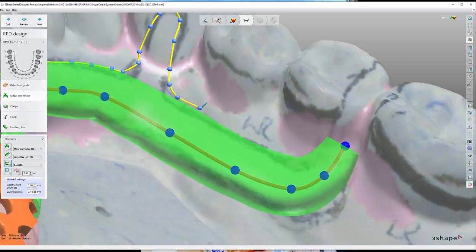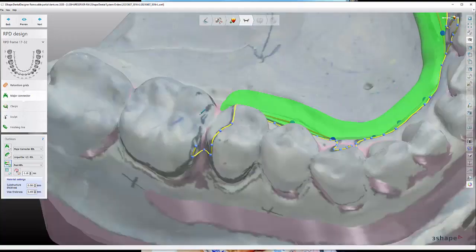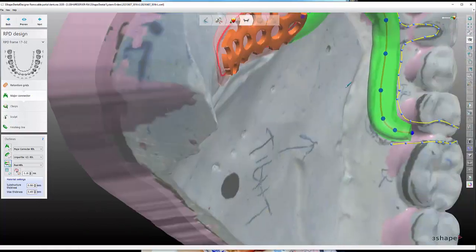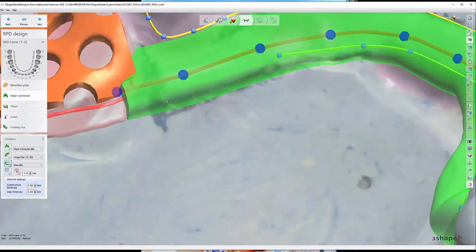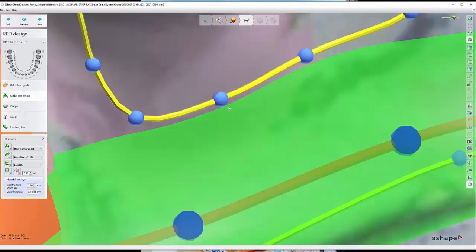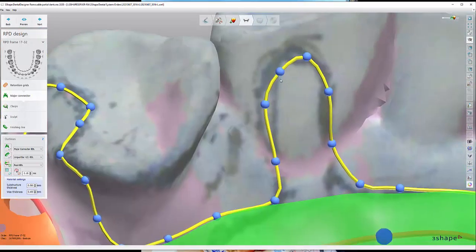I know people do this sometimes differently, where they'll just break out the individual rests. But this is what we've found gives us the nicest transitions for the frames. So I'm just sharing that with you. And I keep this within the green when I come back. So the most important part here really is just the leading edge on the top edge of the bar here. So again, I'm trying to really show how that meets up to the bar.